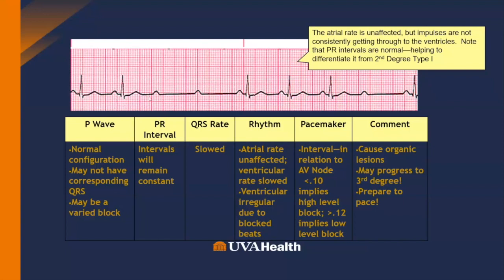So what we look for is this PR interval again, which is necessary to understanding blocks. And what we see is this PR interval is constant. It's constant, it's constant, it's constant, it's constant. So for every conducted beat, we have a constant PR interval, but we also have these P waves with no conduction. And so again, you have grouped beats, another classic hallmark of second degree block. And these P waves may vary. So in this case, you have one P wave without a QRS. In this case, you have two. So it is indeed bradycardic. It is a sicker heart. That's certainly something to be aware of. These patients tend to be sicker.